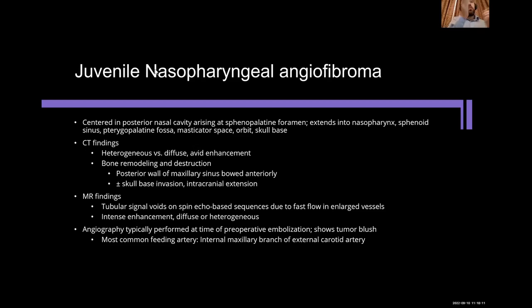When you describe a lesion, describe the anatomical site exactly: look at the main bulk of the lesion, where it is, and then say it is coming from the sinus or from the posterior nasal fossa or like that. I hope this is clear.